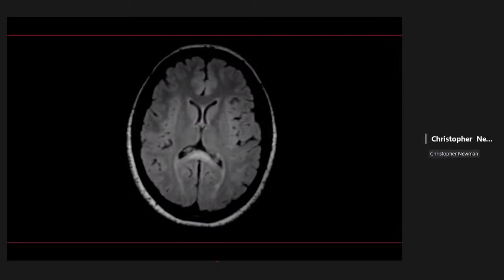The white matter involvement itself would make me think a demyelinating lesion could certainly be part of that. It crosses midline, but it looks so symmetric that I wouldn't necessarily put it first. I couldn't rule them out, but gliomas or lymphomas would be lower on my list based on that look. It doesn't really look mass-like.